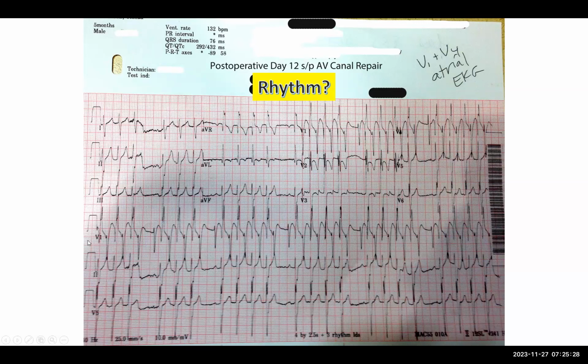So what would we call this? Is this first degree block or third degree block? This is neither. This is like a second degree block, and the PR interval is not increasing for these beats. There are about 3 beats where the P wave is followed by the QRS, and then there is a P wave which is not followed, and there's a drop. So I would say this is a second degree heart block, type 2.